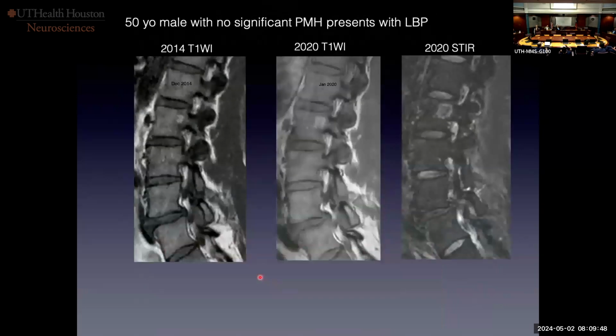All right, so this is a case in the clinic where a 50-year-old comes in with lower back pain, and I'm sure what they're going to be working up was this increased degenerative disc disease and slip at this level. That's why he was there, not because of this lesion that was growing. And in 6 years, you see a lesion that's uniformly high in signal on the T1. It looked the same on the T2 weighted images, and it got larger. And then it had this halo.